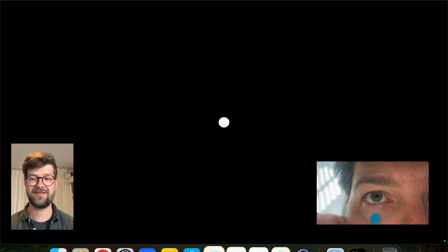So we're now into the pro saccades here, saccading from the middle to the side. This is in a quasi-random order in this specific animation to stop the test subject from guessing what's coming up. The bottom right of the screen here you can see what my phone is seeing at this particular moment. So you can see how my eye is attempting to follow the saccade. And what you might be able to see is that my head has drifted down a little bit, and I think actually a little bit closer to the camera as well. So I didn't do a good job of keeping my head still. So that's why the head position marker can become really important.